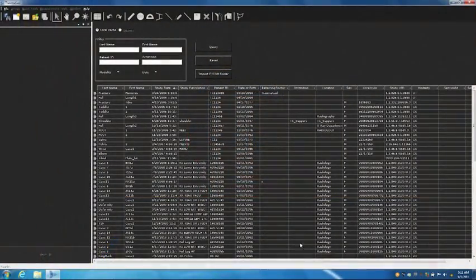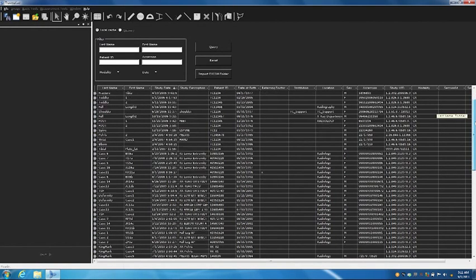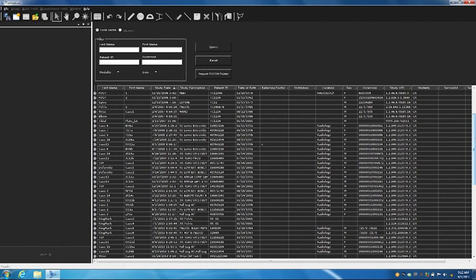So this is the listing of our patients here, and this is how we would identify which patient, which image we're going to use. This is the stuff that can talk with your PAC system and bring up your images. Again, the folks from Brain Lab would have to explain that to you.